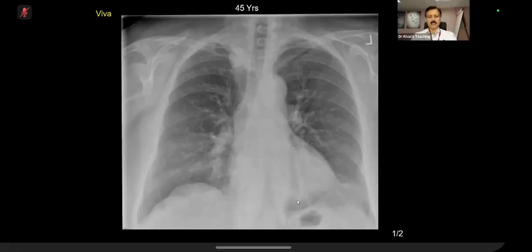The cervicothoracic sign is an extension of the concept of the silhouette sign in chest radiology. What happens is that this is the clavicle. Superior to the level of the clavicle, the lung apex in an AP dimension is quite thin. There is not enough air there.